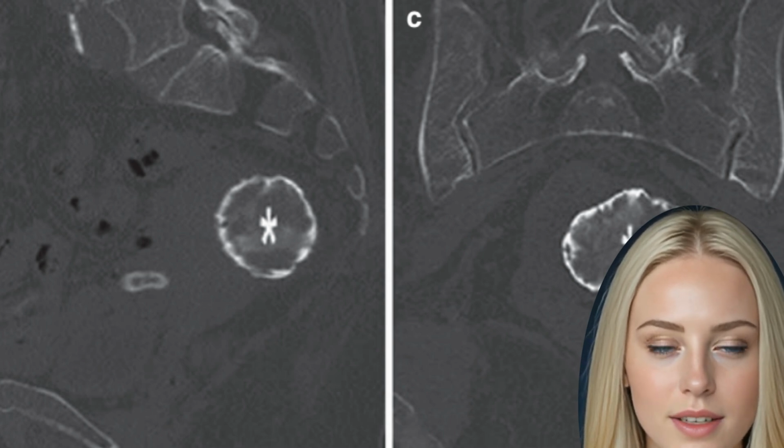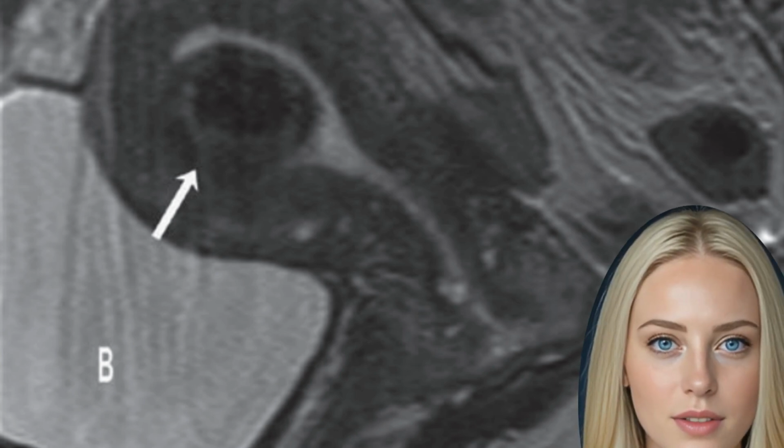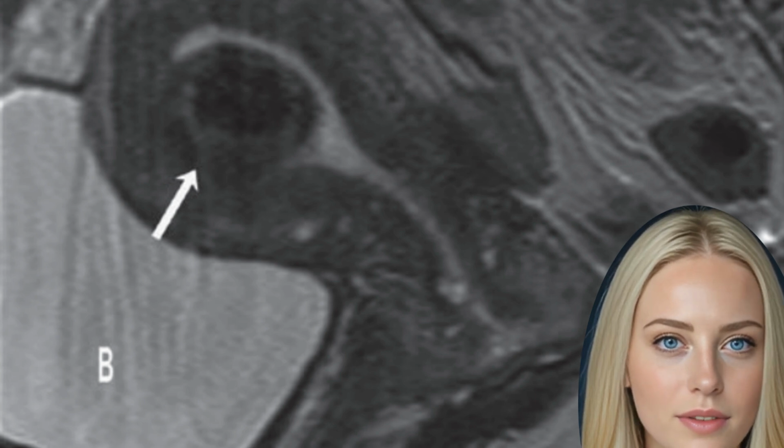One distinguishing feature may be the fact that in adenomyoma, the junctional zone is commonly an integral part of the lesion, whereas in leiomyoma, even a small myometrial layer is notable close to the junctional zone. An adenomyosis uteri is characterized by haphazardly scattered endometrial tissue within the uterus wall. Using ultrasound, the adenomyosis uteri often presents heterogeneous and includes microcysts.